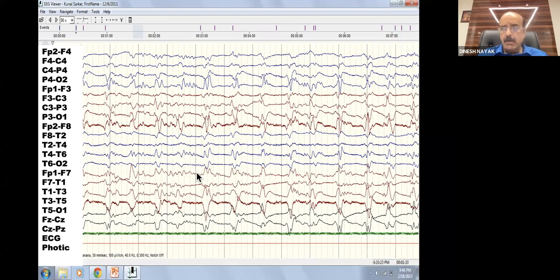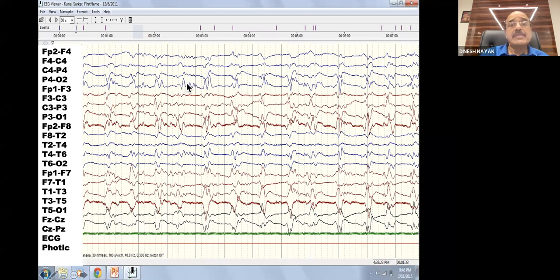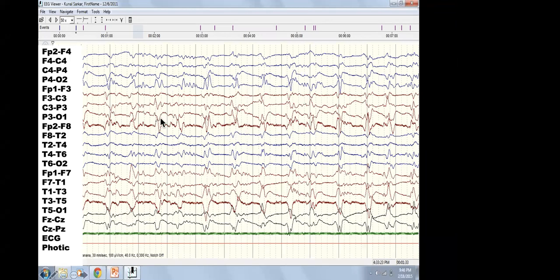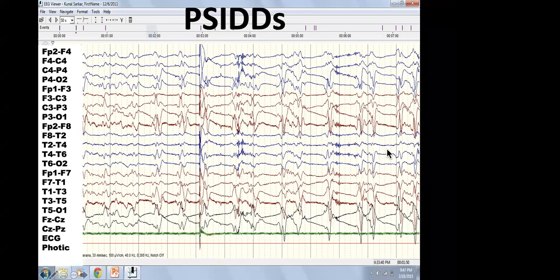And that's another one. Now this is a short interval periodic diffuse discharge, but please remember that in the lateralized periodic discharges we saw some rhythmic after-discharges. Here you are beginning to see some rhythmic after-discharges, even though they are quite widespread and diffuse. Slowly the interval between discharges is coming down, and it is becoming more and more continuous, and it becomes a seizure.